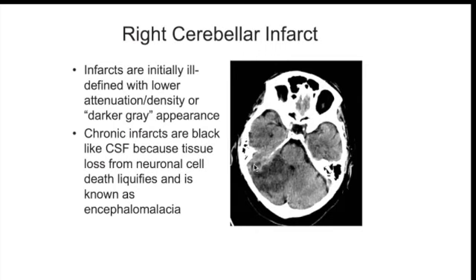No, this appears after a long time. This isn't an acute imaging, okay? The word infarct means that this part is already dead. So this is not what we're looking at in cases of an ischemic stroke, okay? So this patient has a cerebellar infarct, so it means that they had a stroke previously, and now they underwent the normal process of death of this part of the cerebellum, okay?